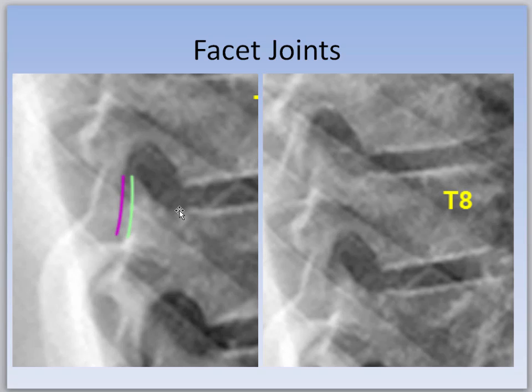Why would you have to say thoracic spine? How come it's not lumbar or cervical spine? Well, because you can see the ribs, right? You can see all these ribs coming across, so you have to say thoracic spine to get the point. And there are no half points with extra credit. It's either you got them or you don't.